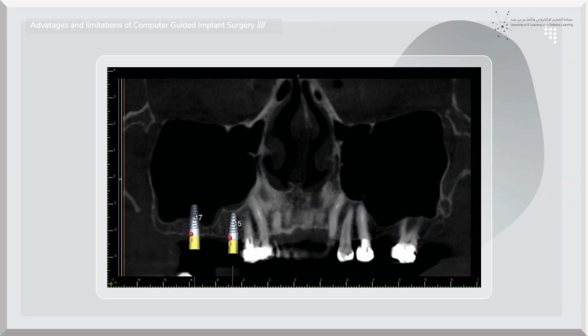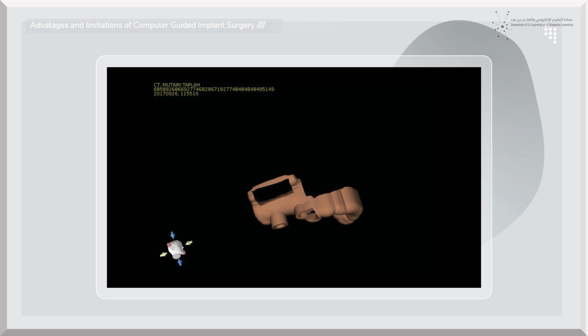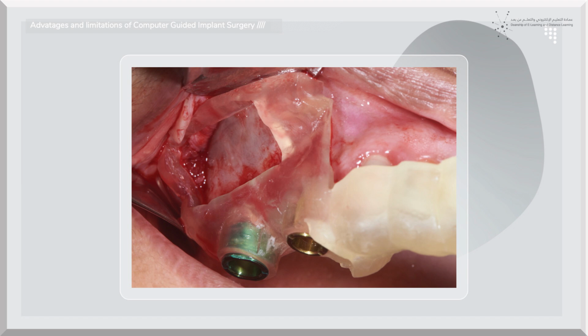So how to incorporate the sinus lift surgery within the prosthetic plan? This can be done by having a surgical guide that guides you in positioning of the bone graft in relation to the future implant location, which is based on the future crown. So this surgical guide could have a little window on the flanges of the guide. This little window can help the clinicians in doing the osteotomy at the lateral sides, and at the same time the sleeve of the implants could guide exactly where the future implants would be. So the bone graft would be exactly aligned 100% with the future implant placement.